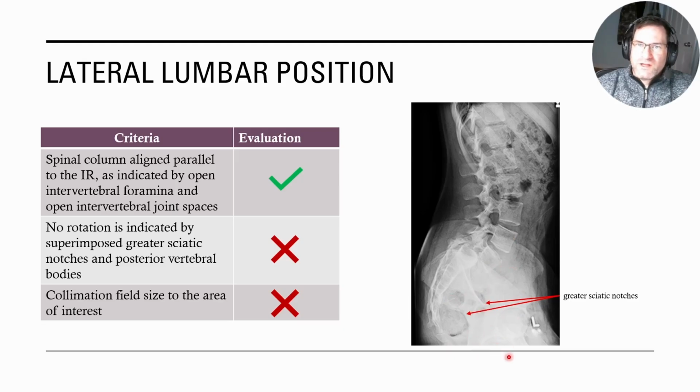You can see the acetabulum in this. So the right side of the patient is tilted posteriorly, rotated posteriorly. It's probably due to the pain they're in, and also the collimation. We only need about 2 inches from the crest, and we have all the way down to the acetabulum. That's a little much. I marked that no go.